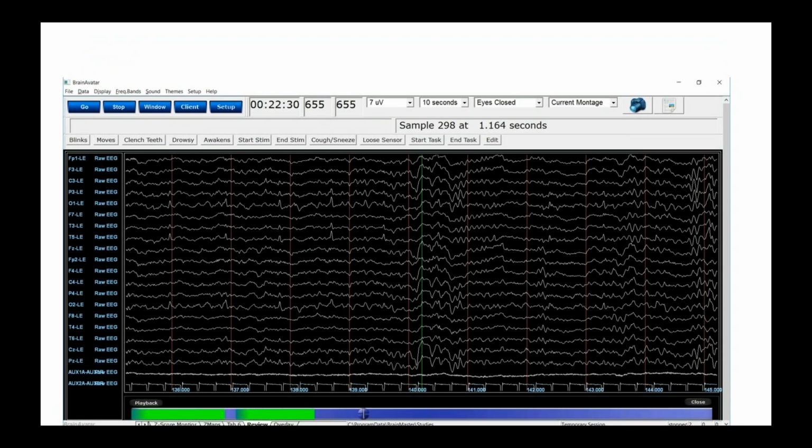So here's an example of some EEG we were using for this work. As you can see, it's 19 channels of EEG with these aux channels showing the appearance of the stim pulses. On the last trace on the bottom, you see these pulses occurring, and they show when we either flash the light or activate the pulsed electromagnetic stim field using an Echo using microTesla coils, or headphones or earbuds, in this case earbuds.